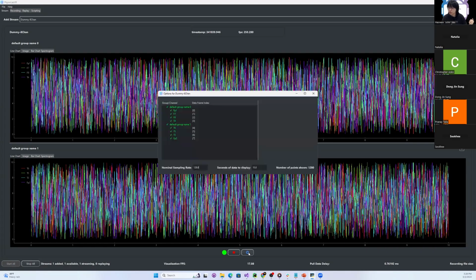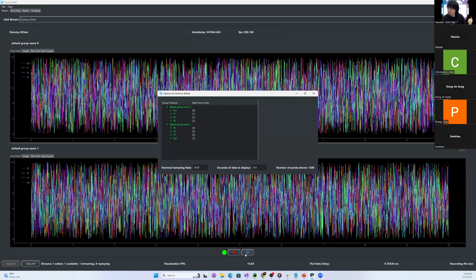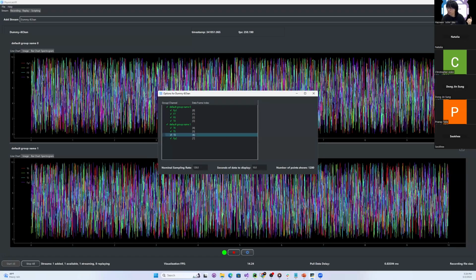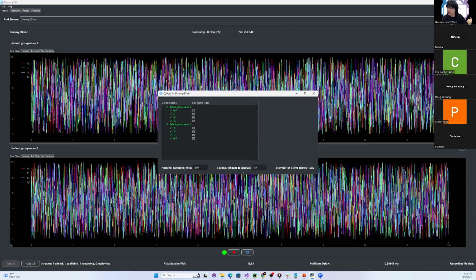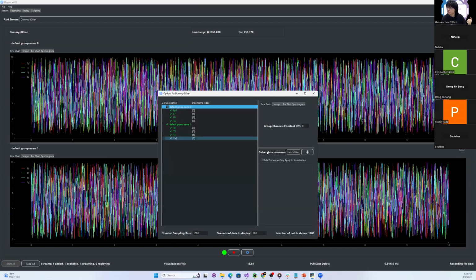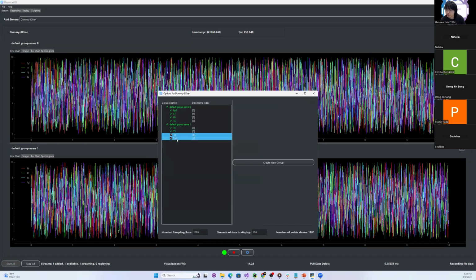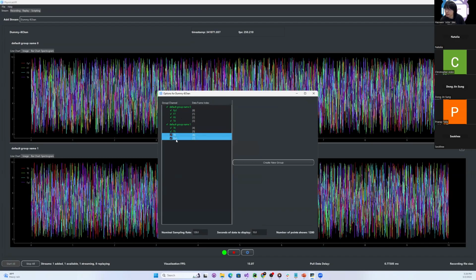And to regroup the channels, on the bottom of each stream widget, there is a gear shape icon right here, and it's a button. After you click it, it will open this settings window, right here. And so, for example, I want to create a separate EEG group for T3 and FP2.